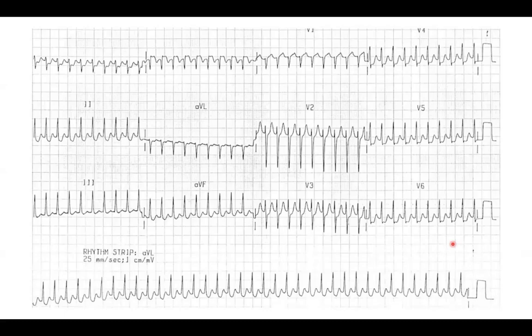All right, so just like our prior EKG, going through this systematically, looking at the rate, we see it's immediately tachycardic, even more so than our last patient, around 170, 180 or so. And we see that it's regular in terms of the rhythm, and we have a narrow complex. So again, we're in our narrow complex algorithm here and taking a look once again for P waves. And we're looking at lead 2 here.